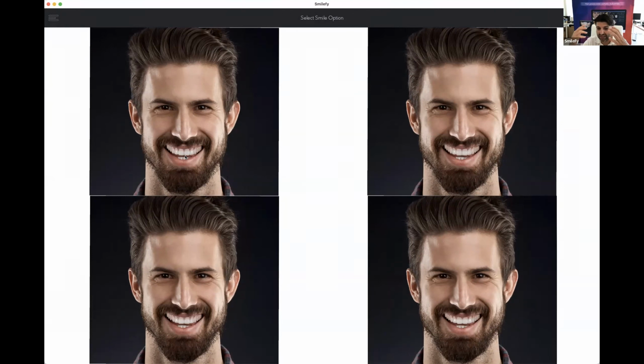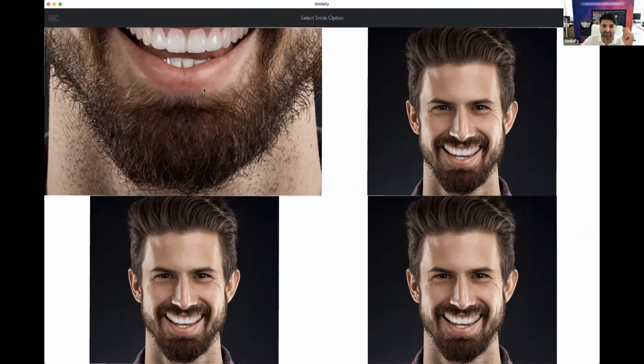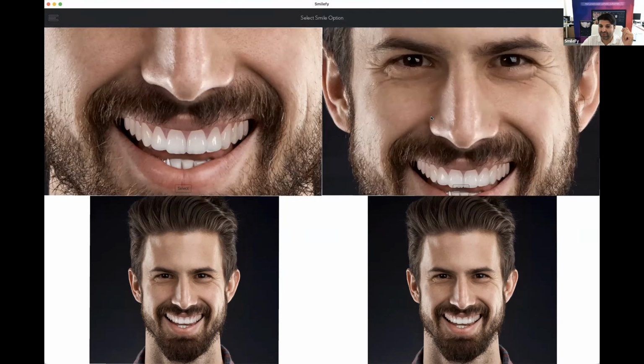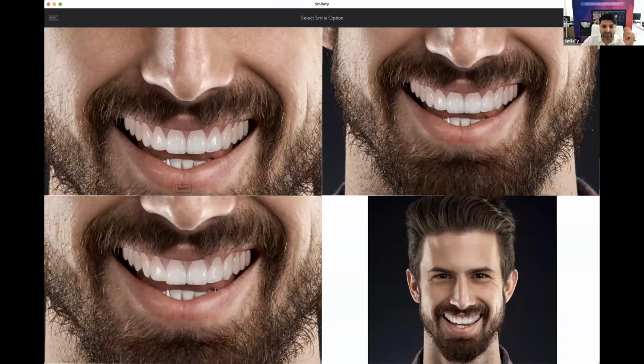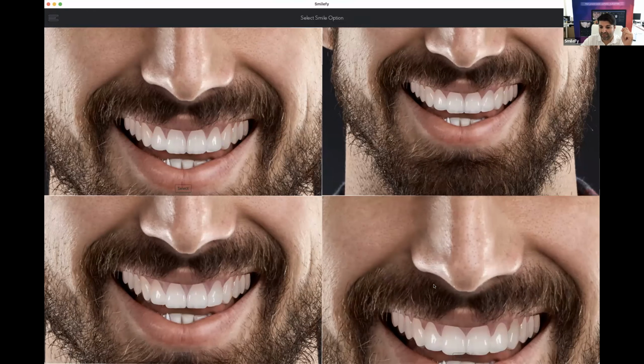Instead of explaining with words, you can show the patient the difference in shape form. We have round shapes with open embrasures. We have round oval shapes with closer embrasures. We have triangular shapes, and we have a mix of all shapes.